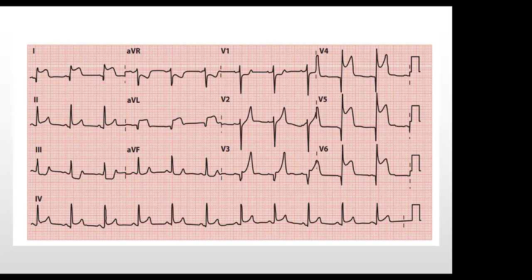I'll say anterolateral. Yeah, V3 also has ST segment elevation. So the anterolateral, yeah, I agree with that.